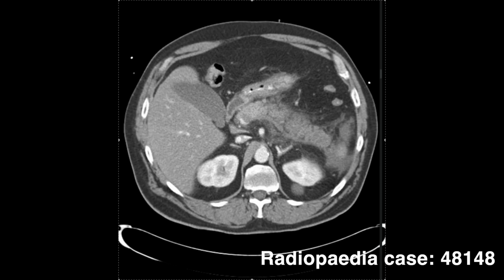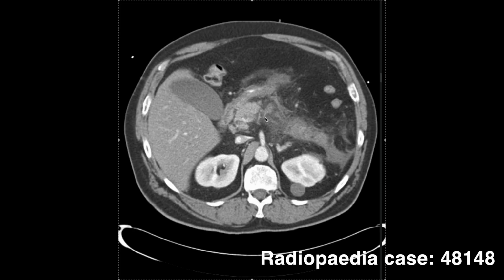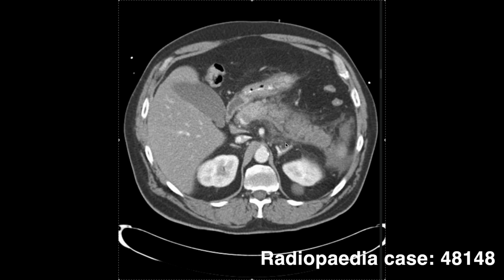Different patient, a different story. Look at the CT compared to case 1. Same organ, completely different disease. This is the portal venous phase. You can see that the pancreas is swollen. You can also see peripancreatic fluid and fat stranding, particularly around the pancreatic tail. You can see many areas of hypoattenuation, especially in the tail and in the body region. That's not an artifact, that's the dead pancreas.